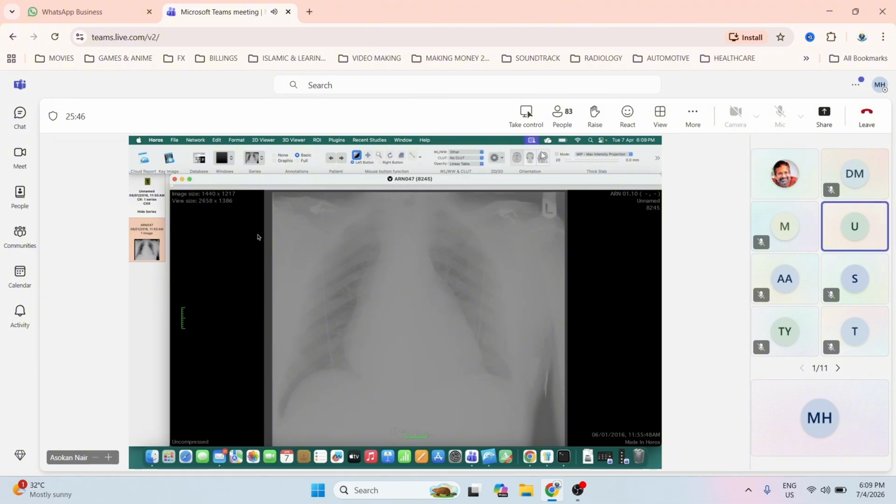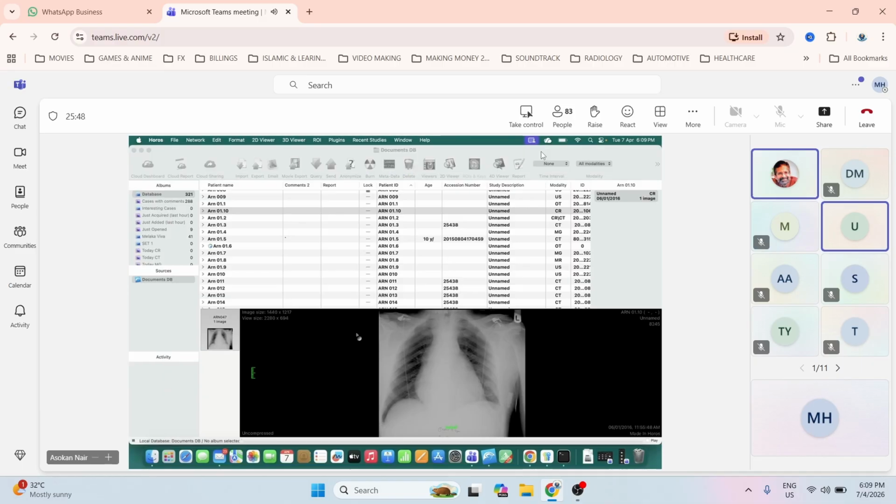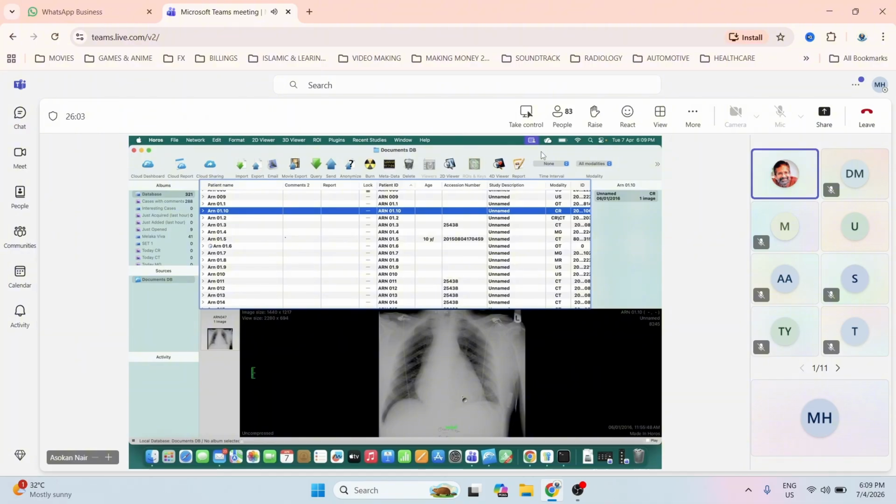Maybe, how's the cardiac output in this particular case? Reduced output. Yeah, okay. So no blood can come out of the heart. No blood goes into the pulmonary arteries, and not much blood goes into the lungs. So because of that, not much blood in the veins as well, right? So that's why for such a big heart, there's no evidence of failure in the lungs. Understood. So these are all the things that can happen. It is a dynamic thing that will explain a lot of things on the radiograph.